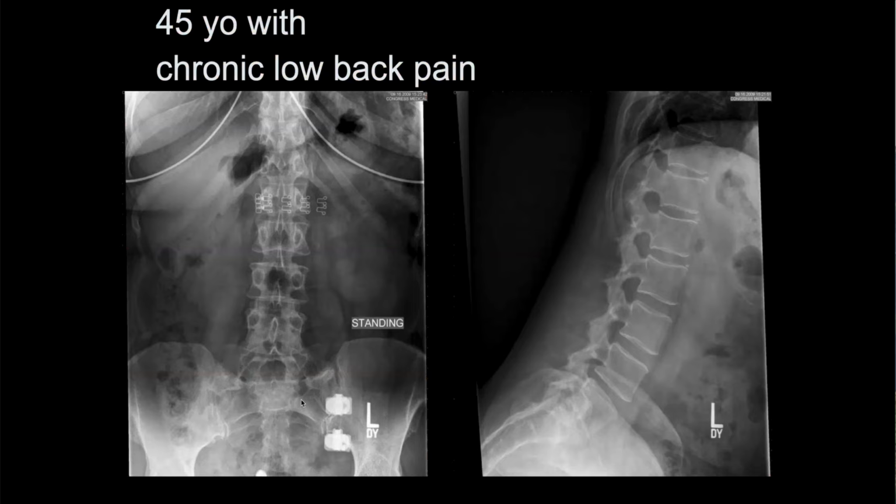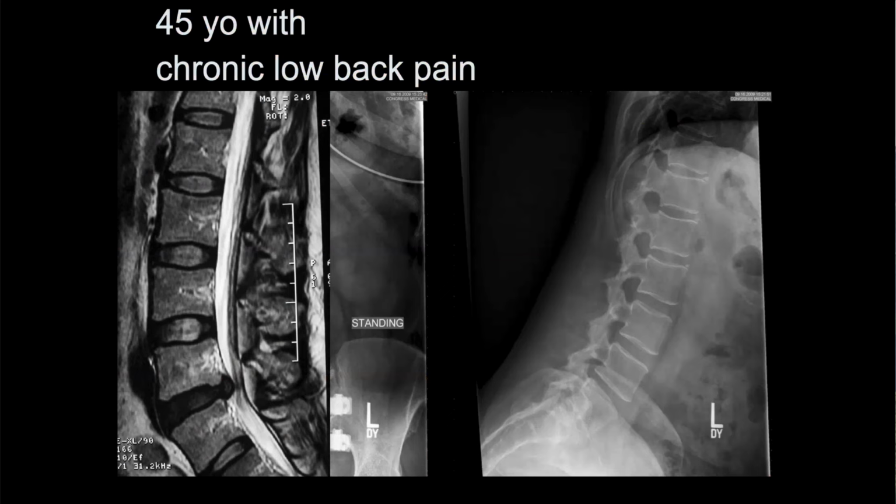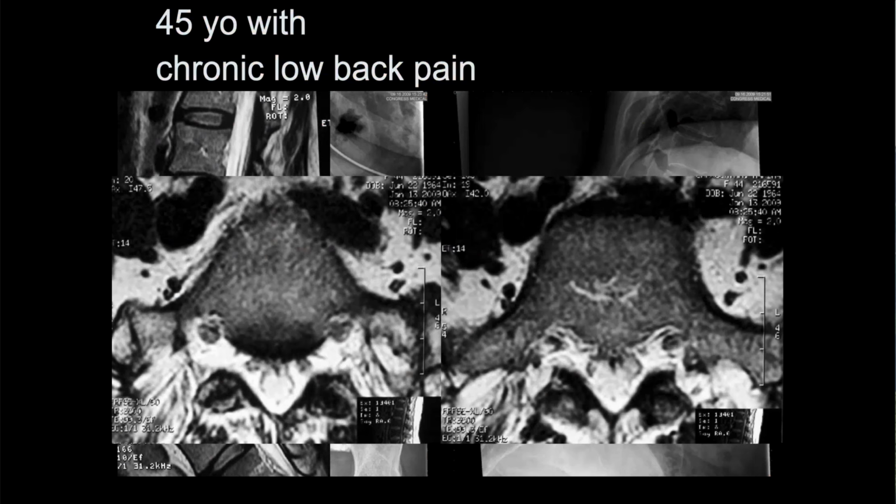So is this 4 vertebral bodies, or is it 5 vertebral bodies and an abnormal S1? Well, what we can see on the MR scan is we have the typical degenerative disease of 4-5 with a disc protrusion posteriorly. 5-1 is relatively normally maintained here in this patient because it's a stable area. A little hard to see here, but you can see the articulations on both sides of what could be the L5 vertebral body.